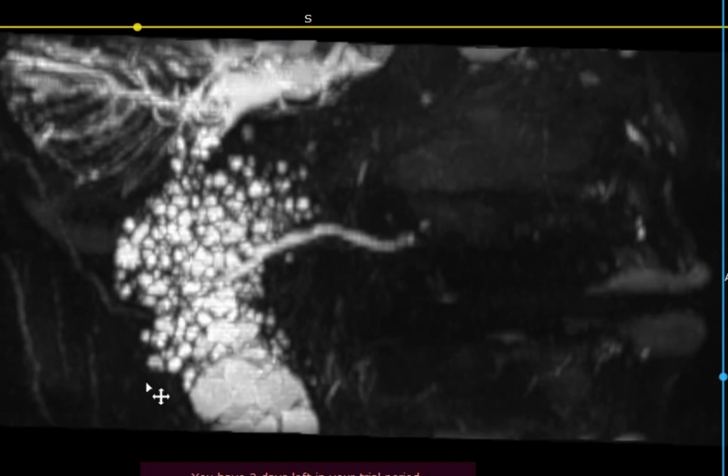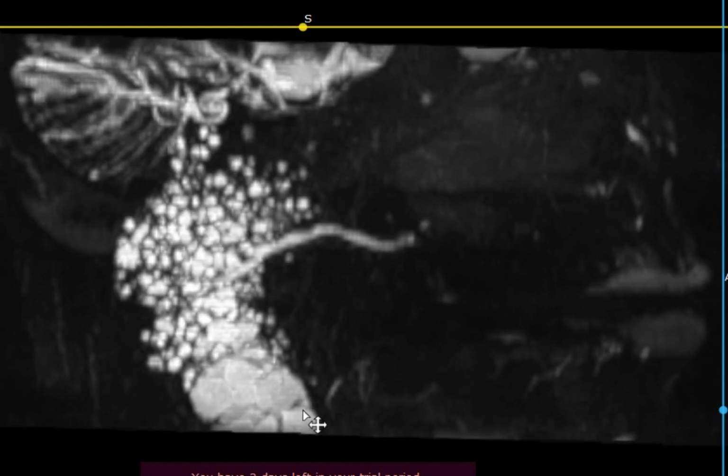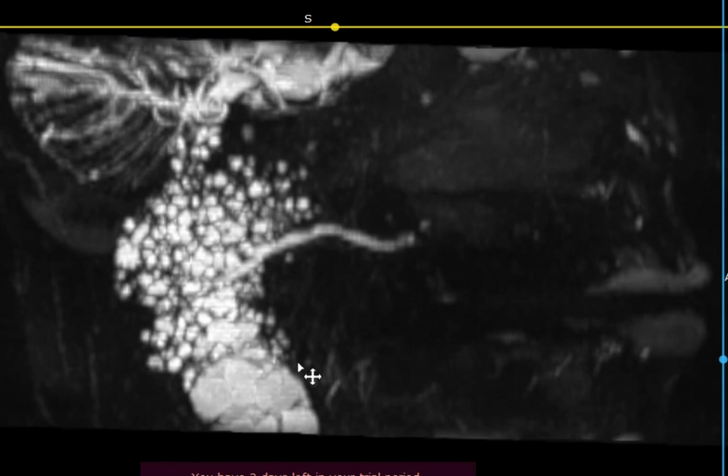But you can see the cystic spaces connected to the duct, which opens into the mouth. Where does it open? Second upper. Exactly, opposite the second upper molar tooth in an MR sialogram. Okay. Very nice, I think.